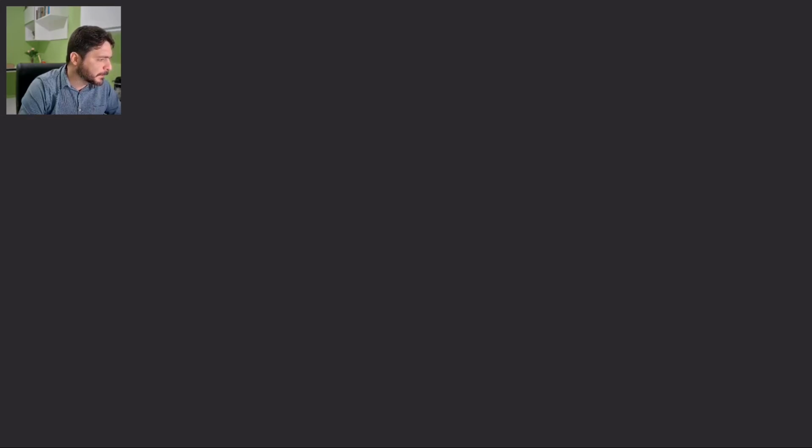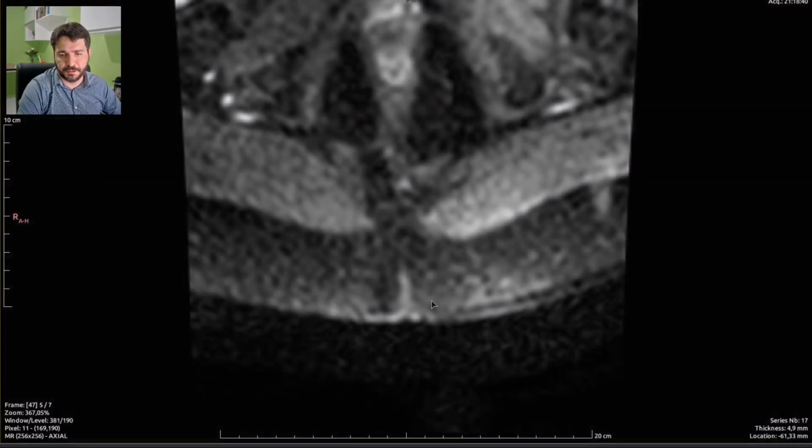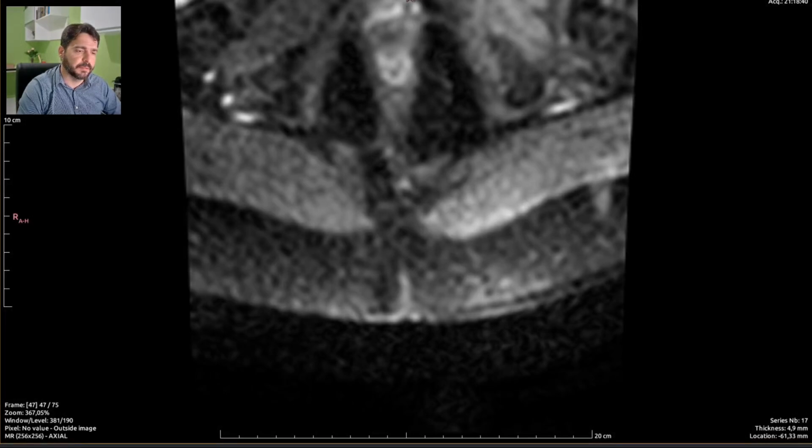She says she has lower back pain, and some inflammatory markers are high, and yeah, that is it. Some kind of odd, strange lumbar pain. Let's load the images and see if they have done it right. I don't think they have. Oh yes, this is it.